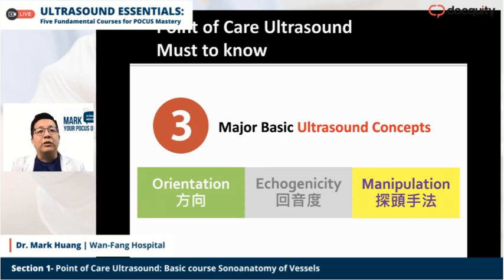The second one is echogenicity, I mean the 回音度. And the other one, you need to know how to use and manipulate the probe. So it's the manipulation, the 探头手法. I will introduce them very quickly, so you can have some insight into ultrasound, okay?